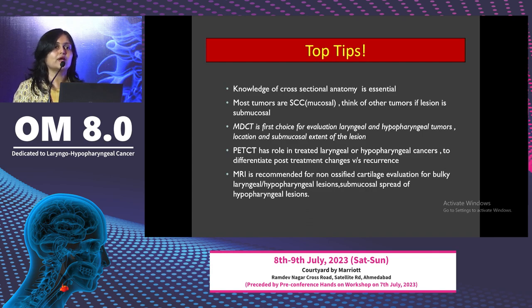I have not included ultrasound, but definitely ultrasound is a part when we are dealing with the evaluation of the neck nodes. It also helps in patients when there is a large exolaryngeal lesion and when scopy may not be feasible. In such cases, ultrasound-guided biopsy definitely helps in evaluation of the disease further.